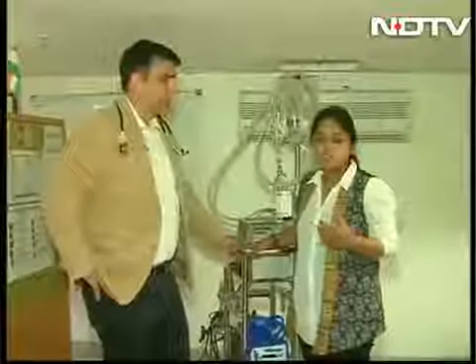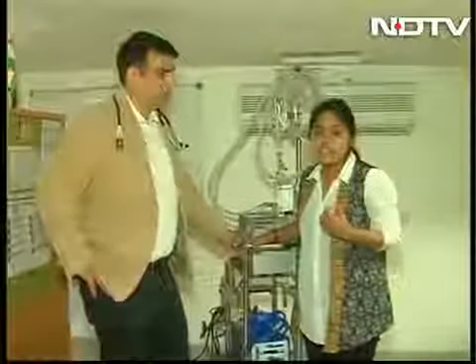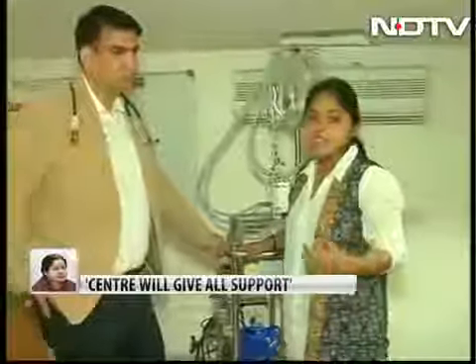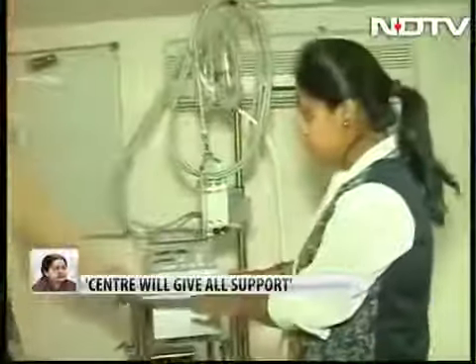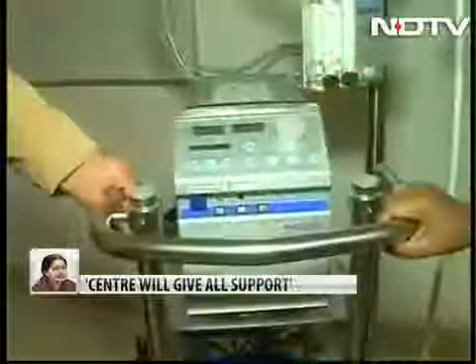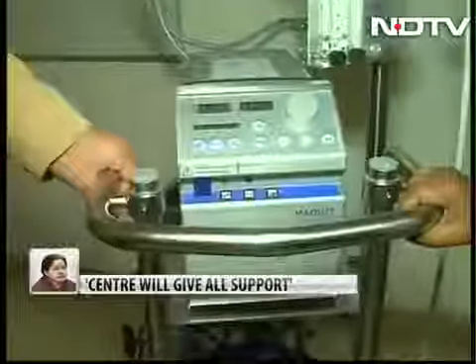When a patient suffers a cardiac arrest, he needs an alternative method to pump blood, and that is exactly what an ECMO machine does. This is an ECMO machine here, and this entire machine acts as an alternative method of pumping blood.